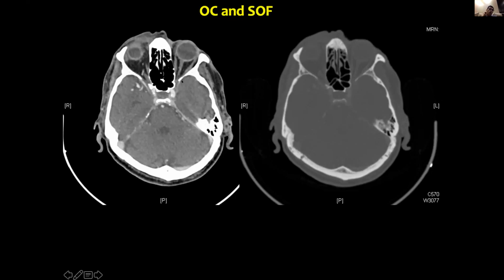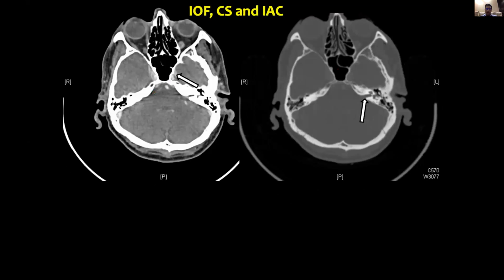This is the optic canal over here. So the optic canal runs medially, and the superior orbital fissures run laterally. They form a perpendicular angle, that 90-degree angle at that cross section. And it is important to remember that superior orbital fissures open laterally.